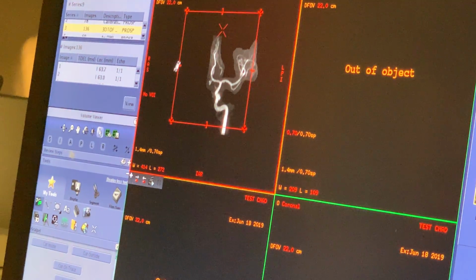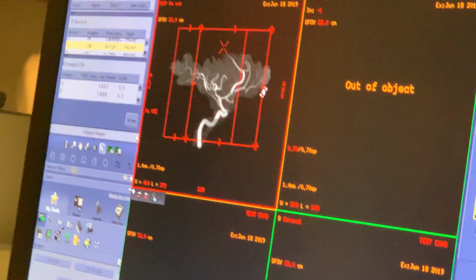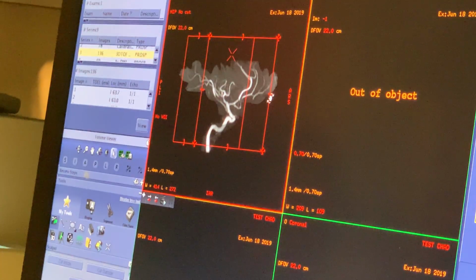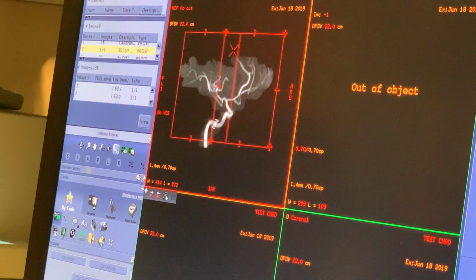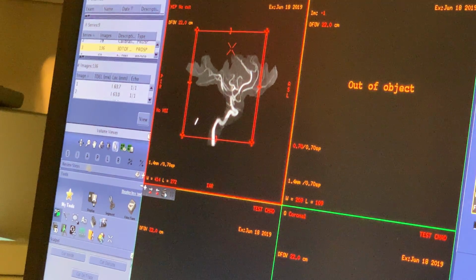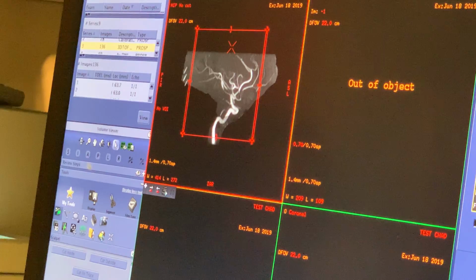All right, so when I spin this, do you see how distracting that beige stuff becomes of all the little, you know, to me, it's harder to see the vessels than it is that other way with just like the gray surrounding them even, you know? So this just to me is just weird looking, but I have seen a bunch of technologists do it this way. So, and I'm not sure how Bill's going to teach you. So there are those two methods of thinking. I prefer my way, but I'm not going to tell another technologist not to do it their way, all right? So, but I am going to undo all that cutting that I just did.